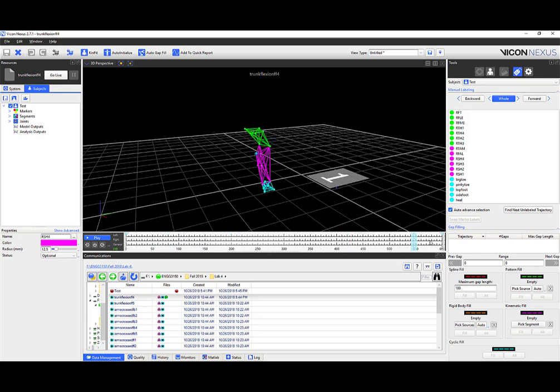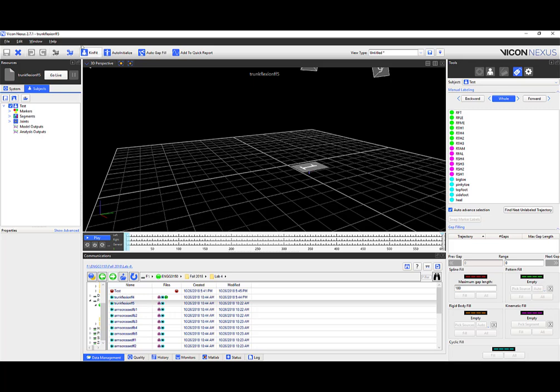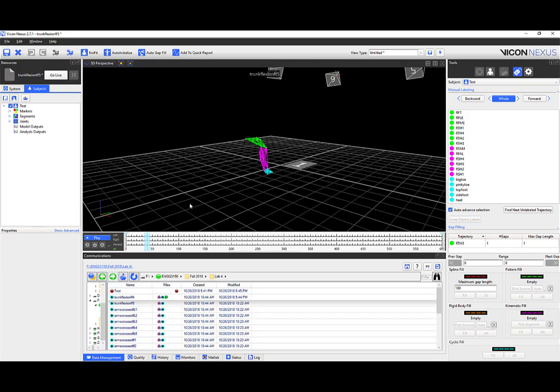This trial obviously looks terrifyingly perfect. If I were to move to another trial, so I open a new trial, and now I don't even have to hit reconstruct anymore. Since I already have a subject in place, I'm gonna go ahead and hit reconstruct and label, and watch this. Pipeline ended. Done. No questions asked, right? It's perfect. But what do you guys notice?